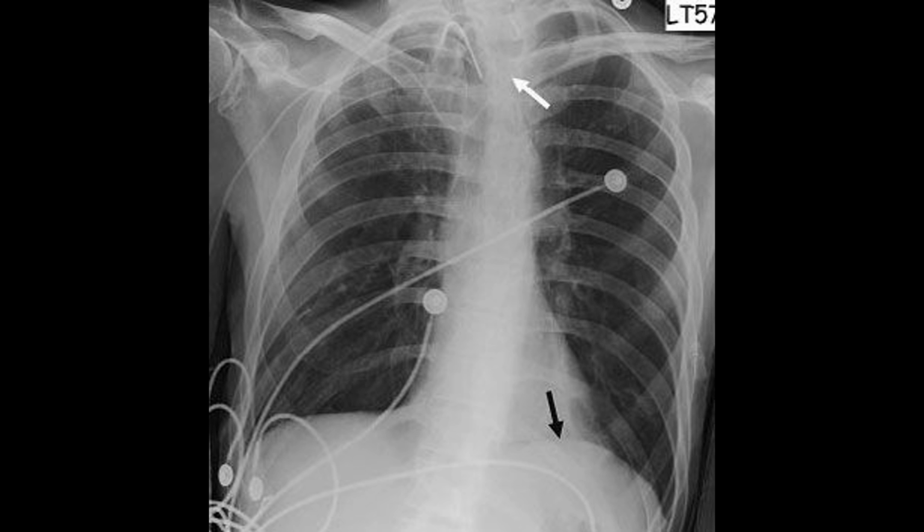On the follow-up film taken the next day, there is near complete resolution of the opacity. The left hemidiaphragm is now clearly visible, and the left heart border has regained its normal curvature, confirming that the collapse was due to a reversible obstructive cause. The peripherally inserted central catheter is incidentally noted to have flipped into the left brachiocephalic vein.